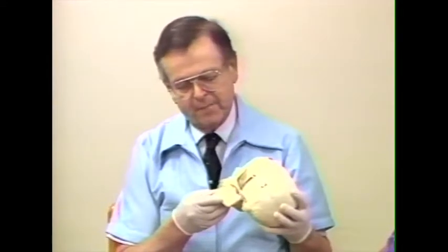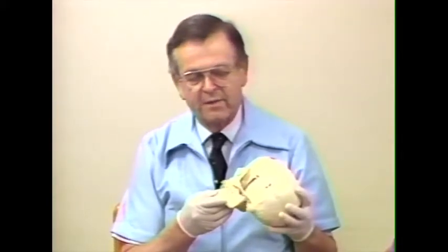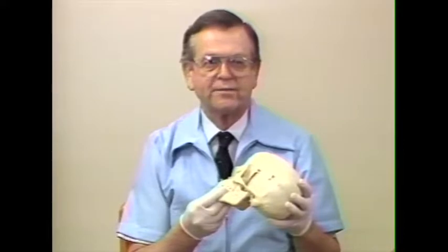The hinge movement is the important one that we want to transfer to the articulator. If we can duplicate that, we can go a long way toward duplicating jaw movement. And this hinge movement has an axis of rotation that is within the condyle. If we can transfer the point where this axis of rotation in the condyle is constant to the maxilla, we have taken a big step toward duplicating jaw movement.